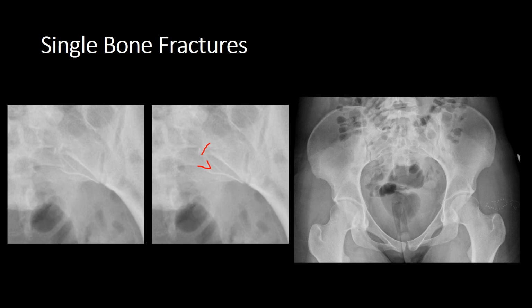So what's going to help you with looking for a sacral alar fracture? Well, of course, always check your SIJs, and normal is 2 to 4 millimeters. So you're looking for potential disruptions to this, maybe a step between the pelvic rim and the corresponding sacrum. But the really helpful clue is to look at our sacral foramina. The sacral foramina are surrounded by a thin sclerotic curved line, and it's these lines that you want to be looking for.